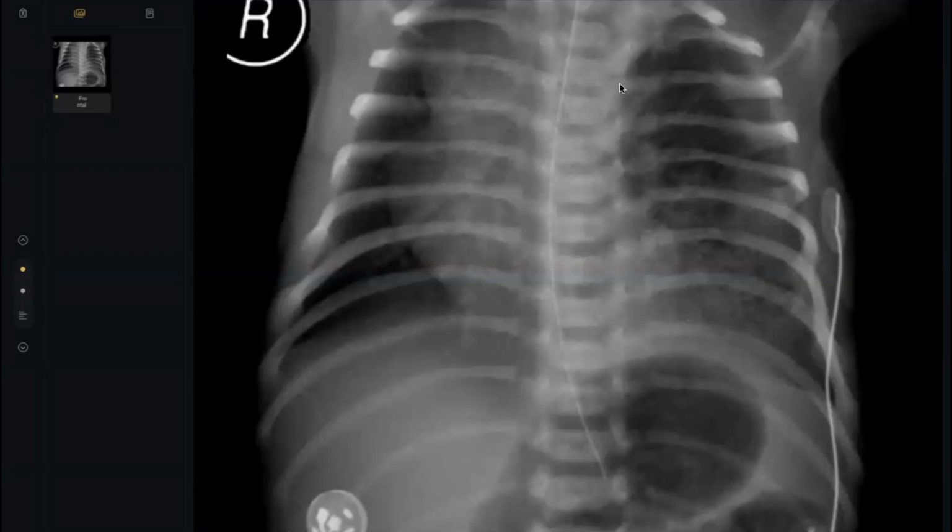Here in chest, there are four maximum pathologies. Most of the pediatric chest are within them: respiratory distress, meconium aspiration, CPAM, and the congenital diaphragmatic hernia.